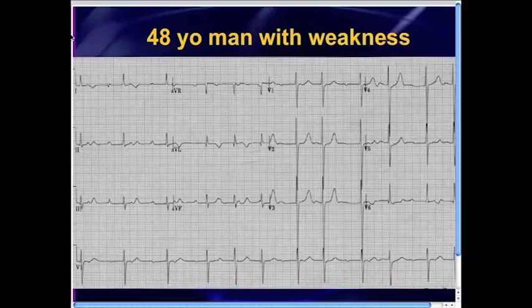And in terms of the P waves, well, there's a P wave right there, and it looks like there's a P wave there and there and there, but there's some other things going on also. Where's the P wave for that QRS and that QRS? And maybe we can assume that those are connected. Well, I'm not really sure. Maybe there's something in there, and maybe there's something right there also. There's little blips in there. I'm not really sure what to make of those blips. And again, blips is a very technical term that I've been using the past couple of weeks.